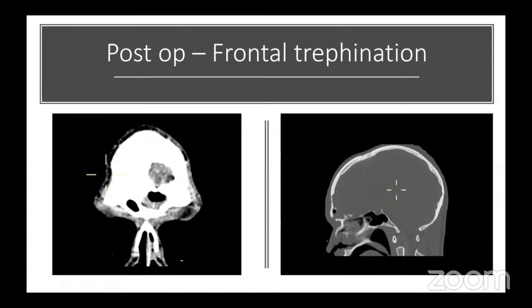This is the immediate post-op picture, which did show aeration within the frontal sinus, and the frontal trephination and the drain in situ with reassuring findings. However, he was under clinical and radiological surveillance, and in the follow-up MRI scan after 6 months, he developed a small mucocele within this frontal sinus. He's on our waiting list for drainage of the mucocele, possibly obliterating the frontal sinus.